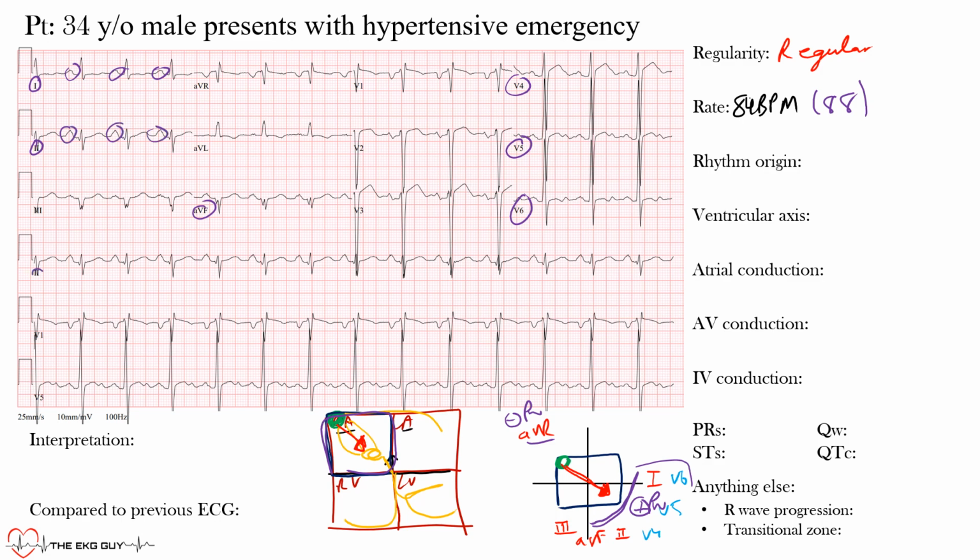So the best one is to look at lead 2 and notice that all these P waves look quite similar throughout. Okay, there's some P waves here that are upright in AVF, V4, V5, and V6. And then we said AVR should show negative ones, which are here. And these are negative P waves. So hopefully that makes sense. And what this indicates is that we do in fact have a sinus rhythm.